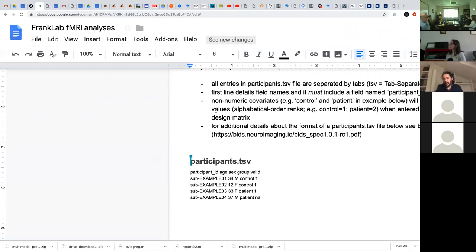The only trick with that, which might be confusing, is that when I talk about group comparisons, typically, at least in the other presentation where we were looking at the GLM, instead of defining a group that has 2 values, controls and patients, you could also have done something like this. I don't know if this is going to confuse you, but I'm going to show you an alternative. You could say controls and patients, and enter 2 covariates: for the first you enter 1 and 0, and for the second you enter 0 and 1.